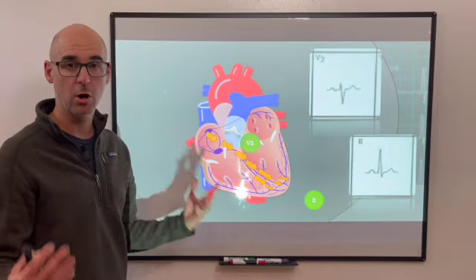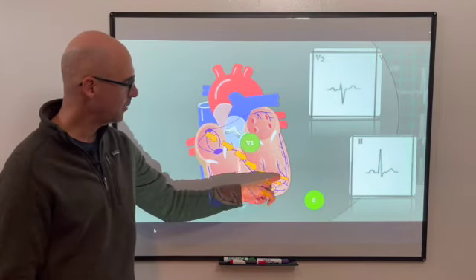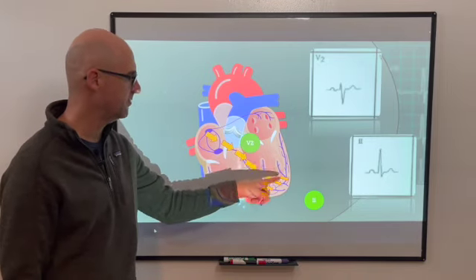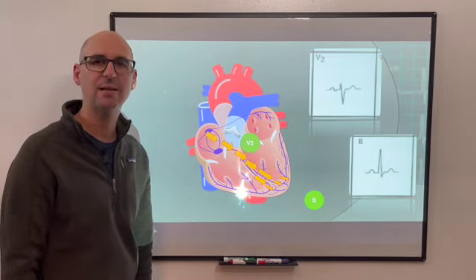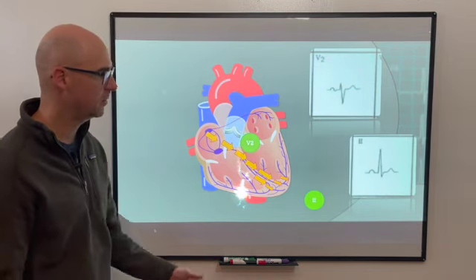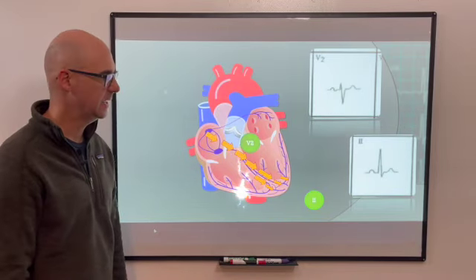It's primarily an R wave followed by just a little bit of an S wave at the end, and that really represents as the conduction gets into the Purkinje fibers, and then just at the end slightly moving away from lead 2. But that's why we have that primary positive complex or an R wave in lead 2.